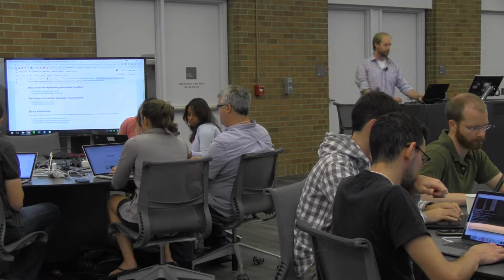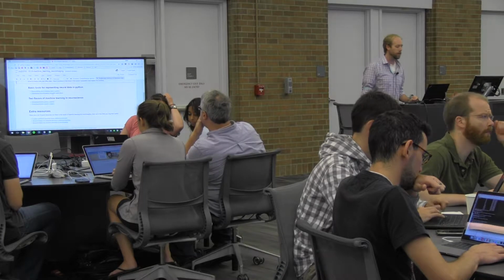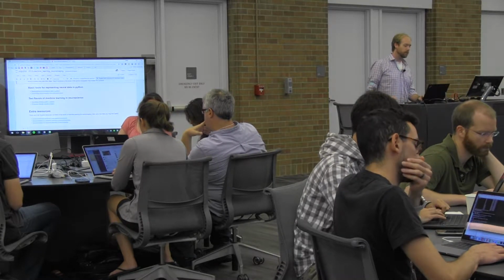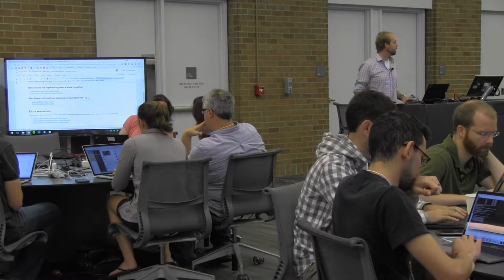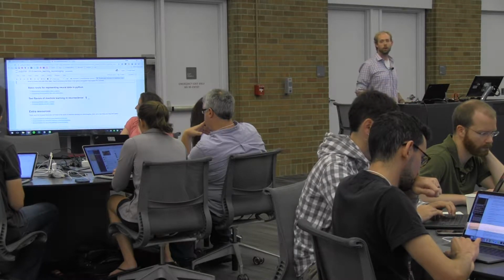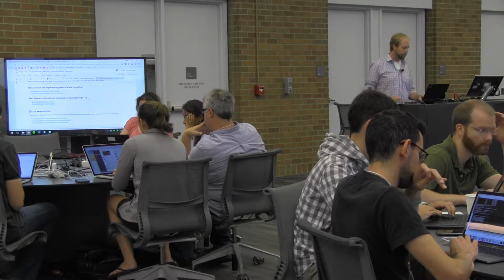Okay, cool. So basically what I'm going to try to go through is hopefully 3 out of the 4 of these main topics here. The first thing I'm going to do is talk about basic manipulation of neuroimaging data in Python, and that's because it occurs to me that some of you just haven't used the Python neuroimaging stack yet. So that should be just a very quick intro.